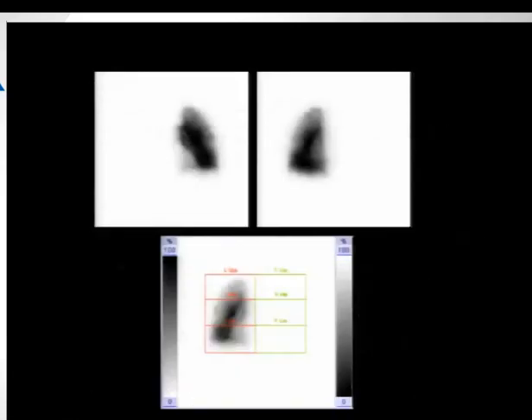Here is a patient who presented with symptoms again, and all these patients present with shortness of breath, so it's difficult to tell what exactly is going on. This patient was unknown to our institution and did not have any known diagnosis, but presented with symptoms. For some reason, we felt that there was some quirk in this particular study, and we thought, well, maybe this could be a tumor. So we actually rescued ourselves from this particular pitfall.